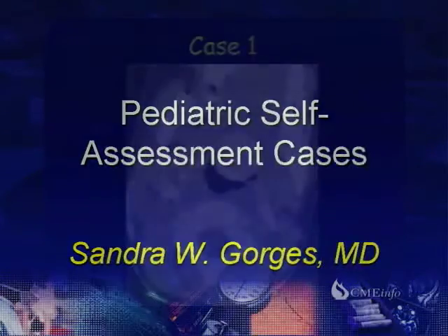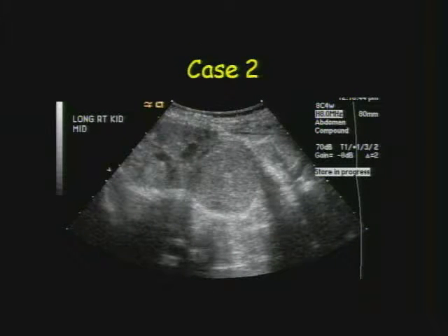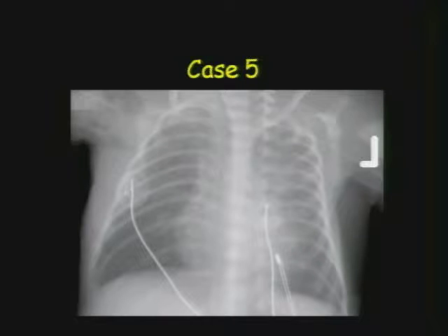So I'm going to show you case 1 as an unknown here. Case 2, it's the right kidney. Case 3, case 4, and case 5.